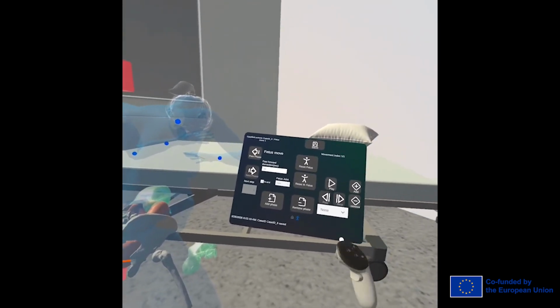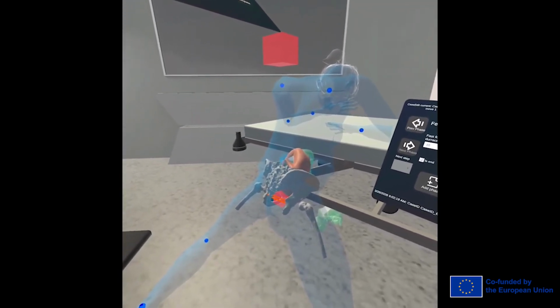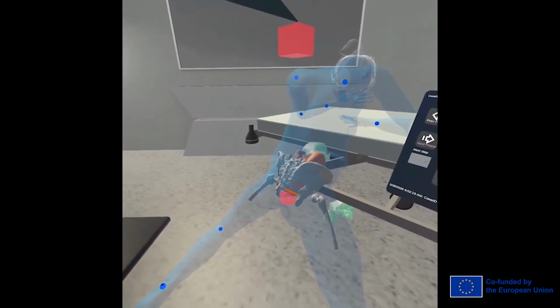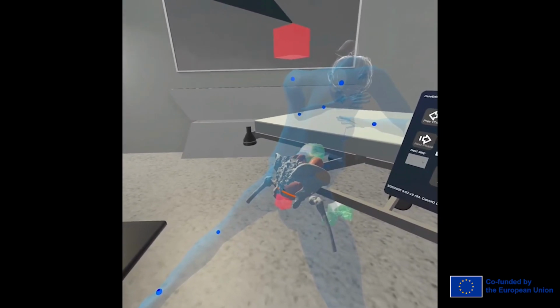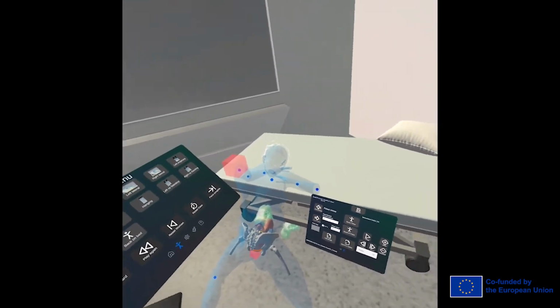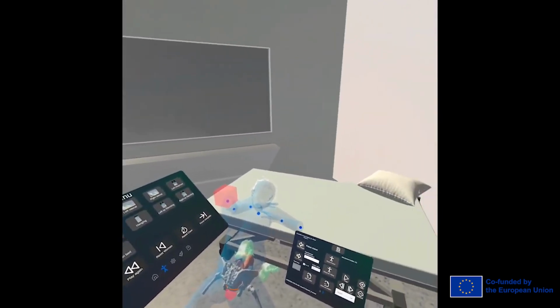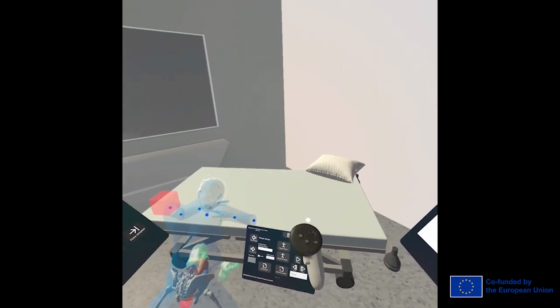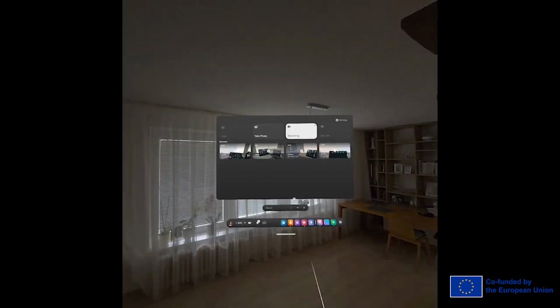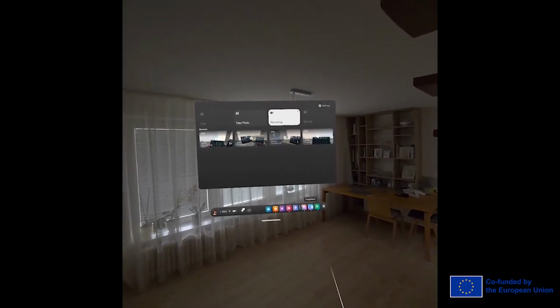That should be it. You can try it out, how the baby moves. And it moves nicely into the position where I want it to. So we're going to test out the scenario itself. Before you are able to fully test it, you will need to exit the application. So I'm going to go quit. And I will start it again.